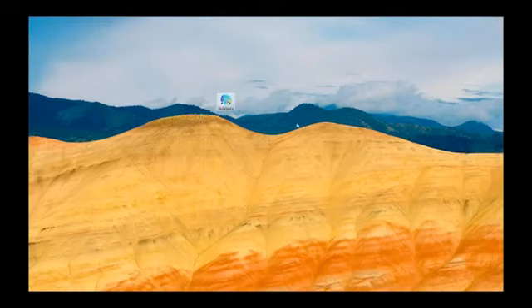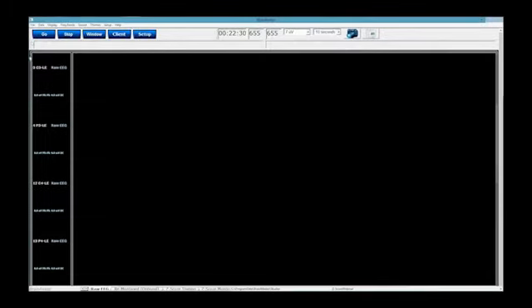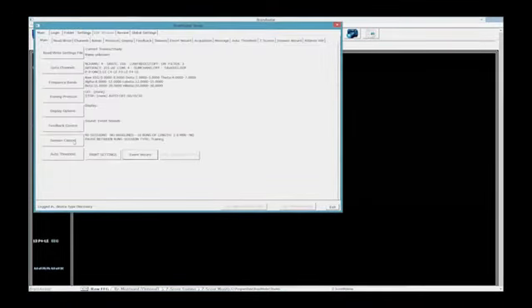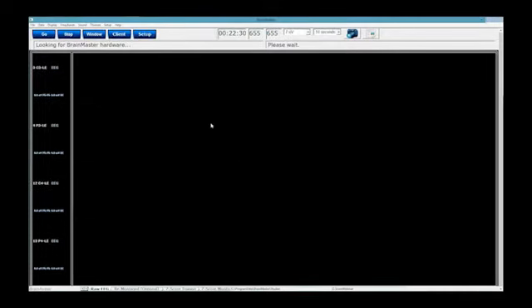Now what I'm going to do is close the software and open my software again. This time we're going to look at a PZOK UL training. The difference with this one is that it says UL, which stands for upper and lower. So that's why the difference in the names. PZOK is just your standard PZOK; PZOK UL is upper, lower. This time I'm going to grab a BrainDx one. I'm going to double click it, go to Setup, go to my session control, set it to simulation, and hit go.